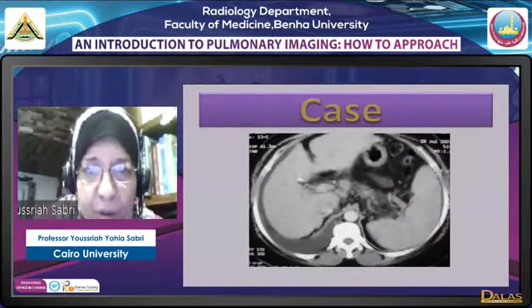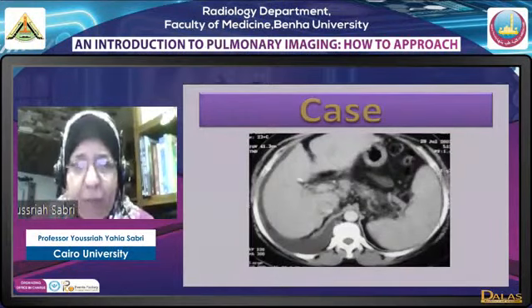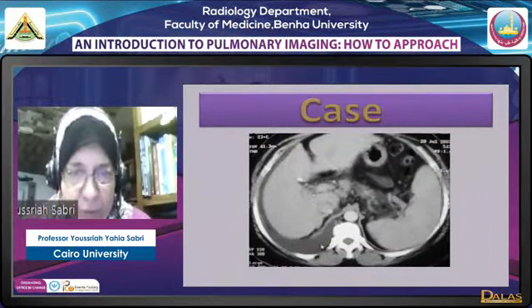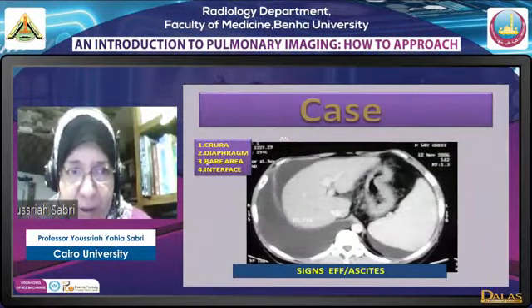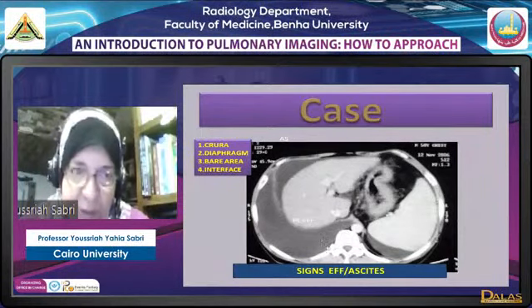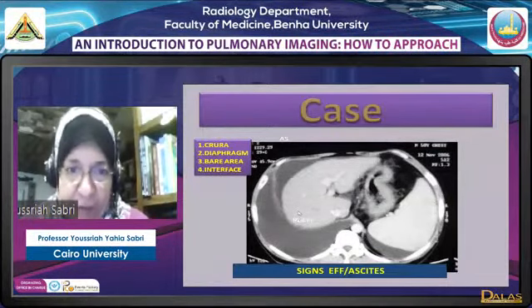Now here we need to differentiate between effusion and ascites, the four signs that differentiate effusion and ascites, as you see them here. The crura sign: effusion will be medial to the crus, this is the crura sign. Posterior to the cupula, this is the diaphragm sign. It will fill this region, which is supposed to be the bare area. In case of ascites, the bare area has no water.